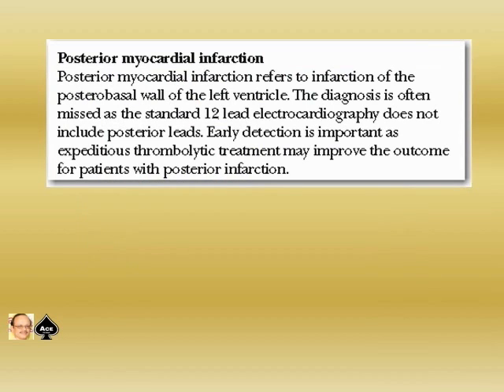Posterior wall infarction. Posterior myocardial infarction refers to infarction of the posterior-basal wall of the left ventricle. The diagnosis is often missed as the standard 12-lead electrocardiography does not include posterior leads. Early detection is important as thrombolytic treatment may improve the outcome for patients with posterior infarction.